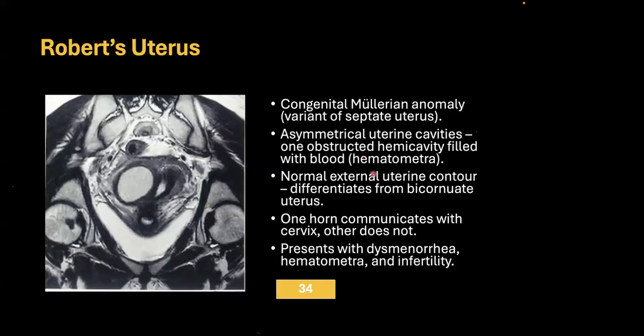Okay, you can see asymmetric uterine cavities. This one is obstructed. I guess most of you can appreciate this.